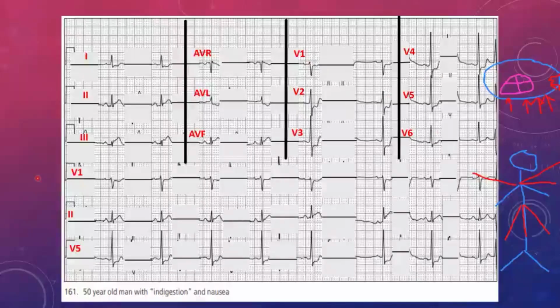So we know already that we have a patient who's got signs of an acute infarction. It's an inferior infarction. It may be going to the right-hand side. It may even be going posteriorly. We have ST elevations. We have ST depressions. So that confirms that it's an ST elevated myocardial infarction. So you know that you've got to start already.